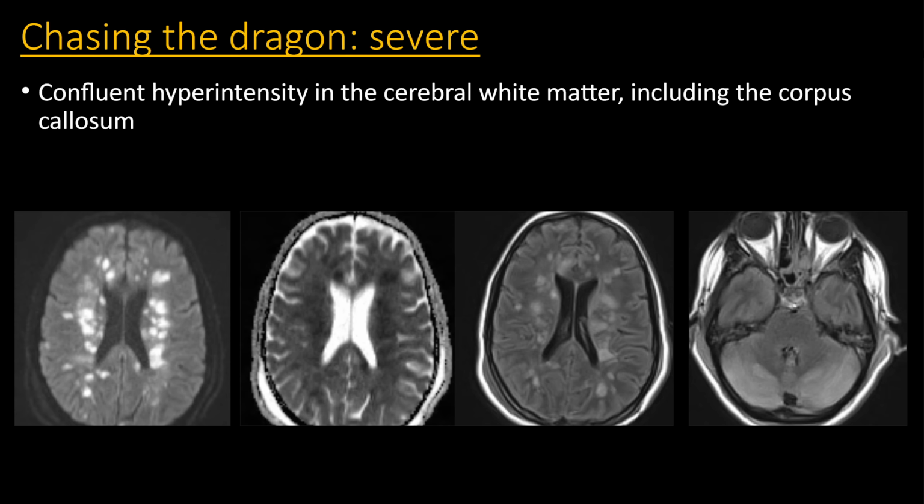Here's a case that I came across. You can see much more widespread hyperintensities throughout the white matter. There's still some cerebellar hyperintensities. It's not quite that butterfly wing appearance, a little bit more nonspecific, but quite substantial hyperintensity also in the cerebellum. This particular case happens to show that, as is typical of these toxic metabolic conditions, you can have diffusion restriction with them.